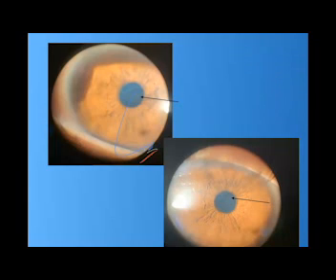Because this is the image of the patient. This is the slit lamp photo captured for the patient. Look at the center. You will find a faint opacity crossing the pupil and crossing the center. This opacity extends from the superior cornea down to the pupil. So it explains all those irregular points and the steep points in the cornea.